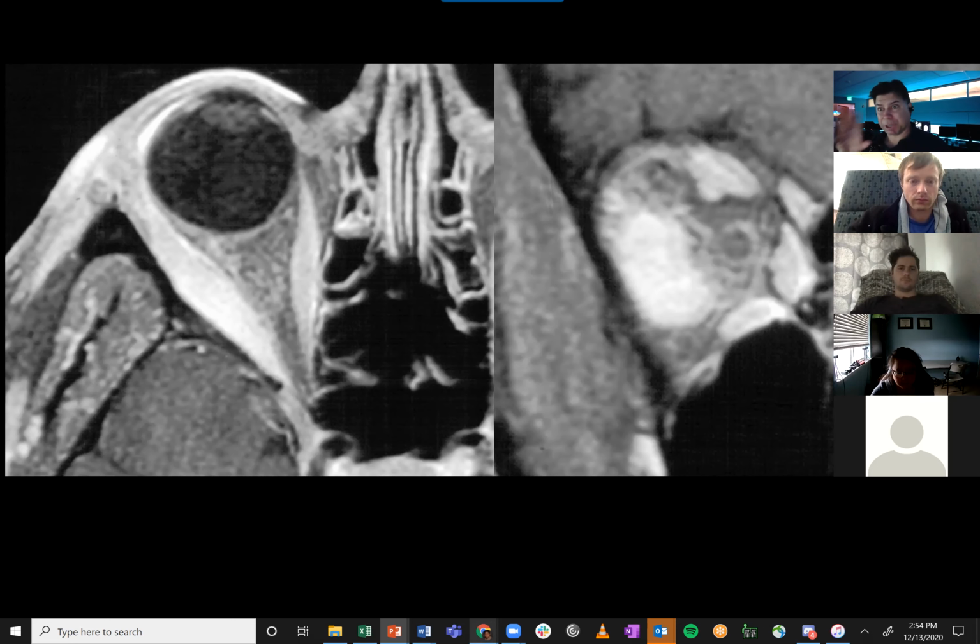There doesn't seem to be any bony erosion on either image or significant bony remodeling. So this could just represent what are the soft tissues around this guy? Yeah, we often talk about lesions in the head and neck, and we talk about the stuff around it. Is anybody angry about this thing? No, nobody seems to care. Yeah, everything looks really nice.